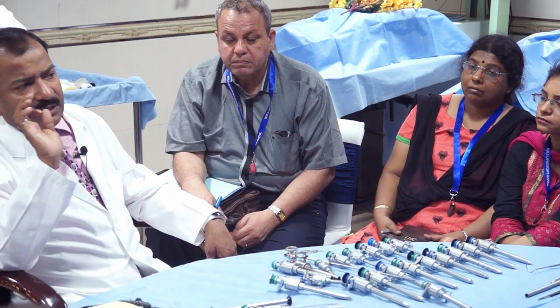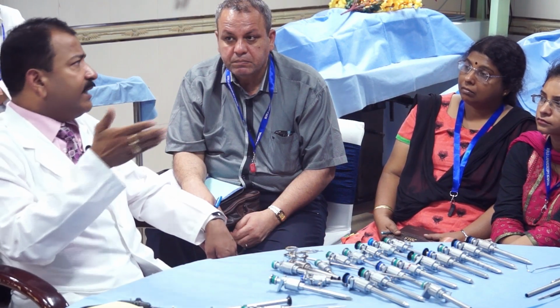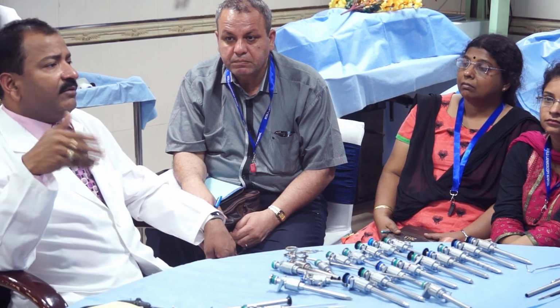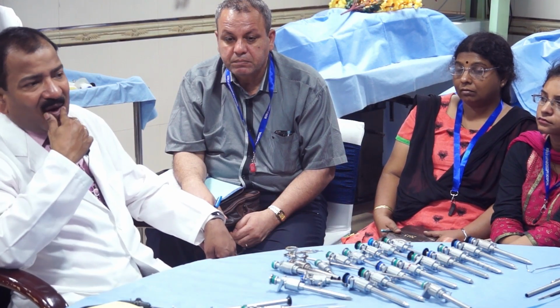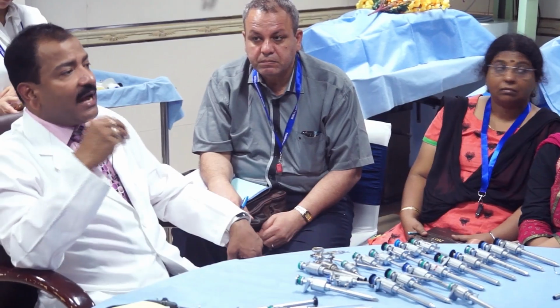Wherever you are having a problem, you should ask about the ergonomics. We will keep watching you and correct your ergonomics, but if you are struggling yourself, you should not hesitate to ask us. Dr. Chauhan and I will also be there, and we will help you find out where the problem with the ergonomics is.